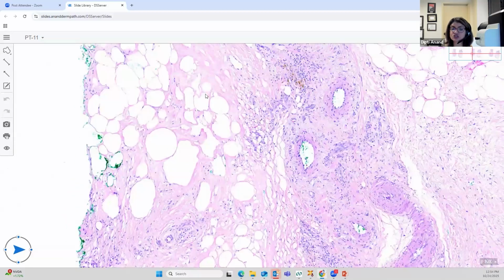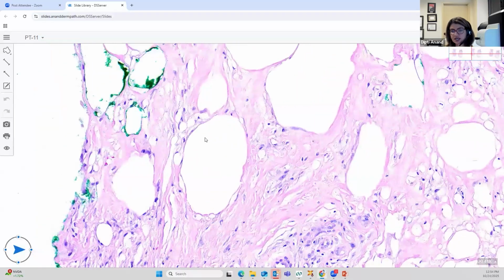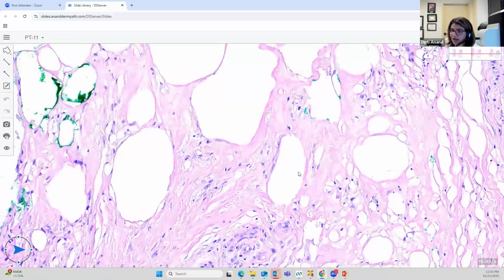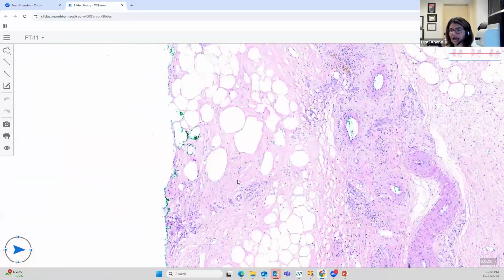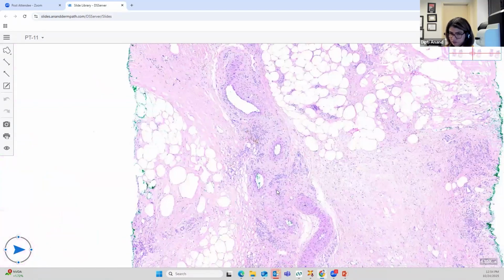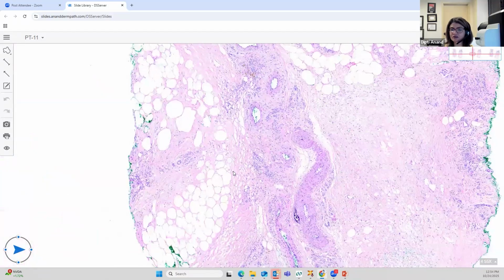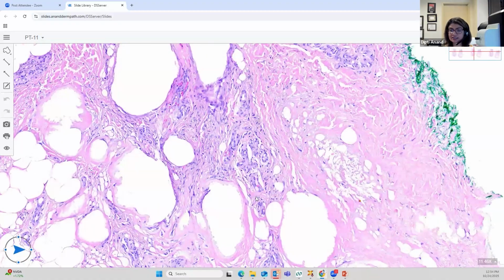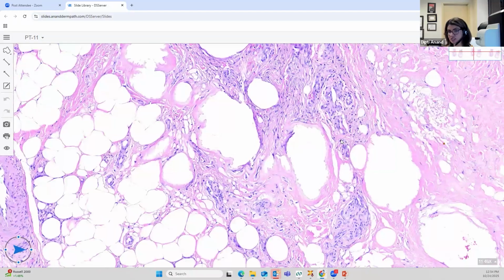The only inflammatory cells that you may see are the xanthomatized histiocytes, because the histiocytes have come in to gobble up all this destroyed fat. So you will often see histiocytes. And the other thing that you can see is this old blood or hemosiderin. That is very indicative that there is venous change involved in this pathogenesis, and that's why it is producing chronic ischemia and hemosiderin deposition. So pink, bland fat necrosis with no lymphocytes, with hemosiderin deposition, with histiocytes gobbling up the destroyed fat, and then the classic finding of membranocystic fat necrosis.